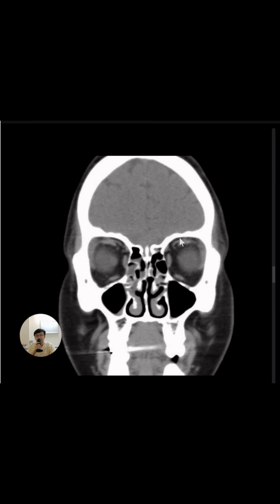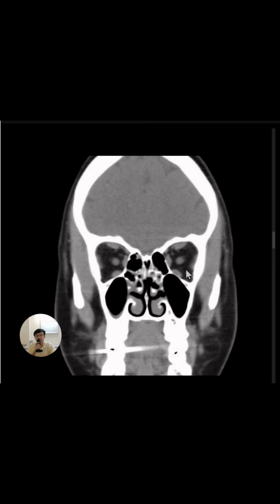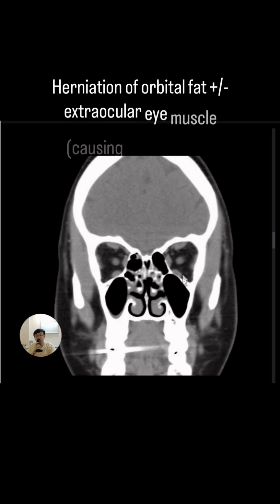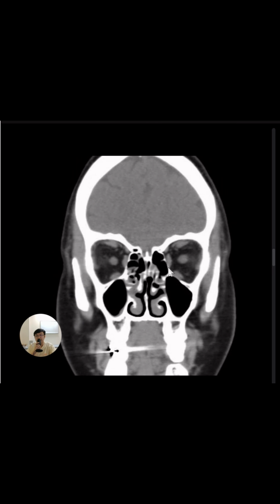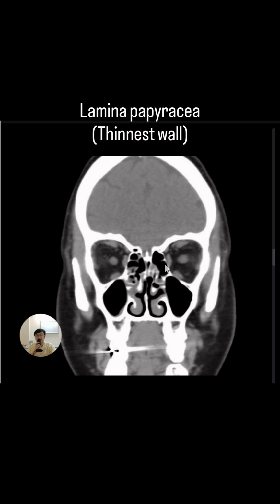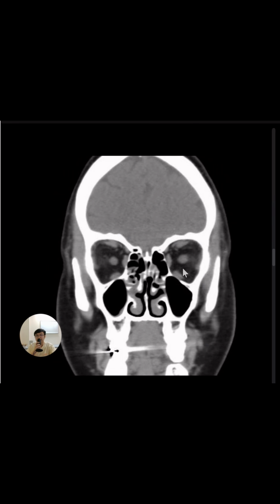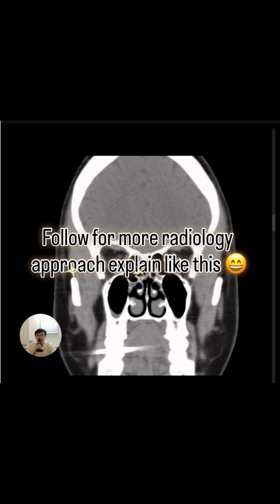And also we can notice the superior wall and also inferior wall. Sometimes there is orbital blowout fracture involving the floor, and then there is herniation of the fat and also extraocular eye muscle there. This may also happen to the lamina papyracea, which is the thinnest part of the orbital wall as well. So take note of all these features, and then next time you can screen that very effectively, especially in trauma setting.